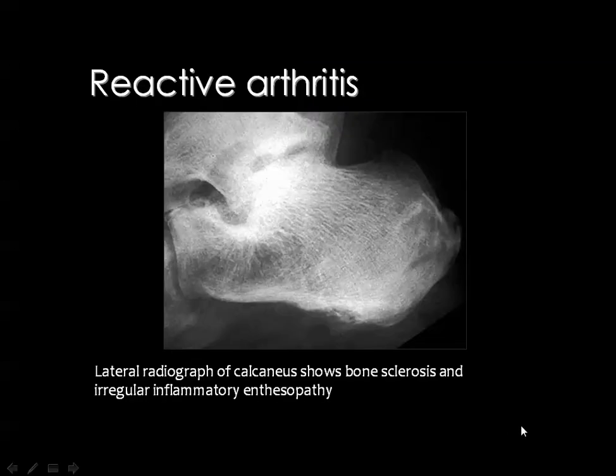And this is what we call fluffy periosteal reaction, irregular inflammatory changes near the site of the calcaneal spur.